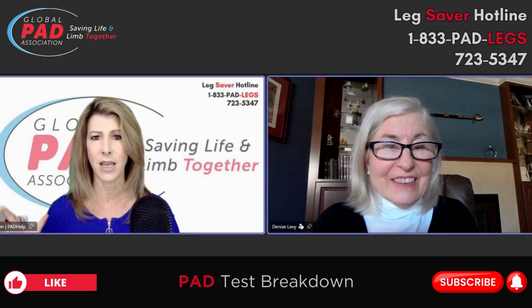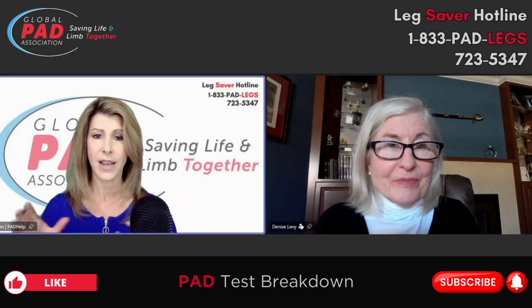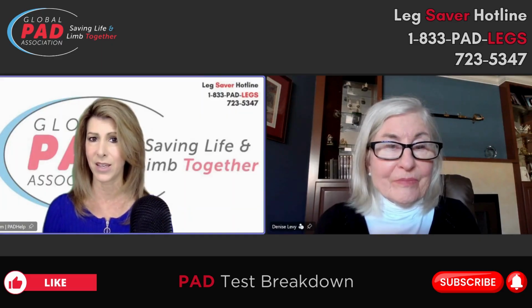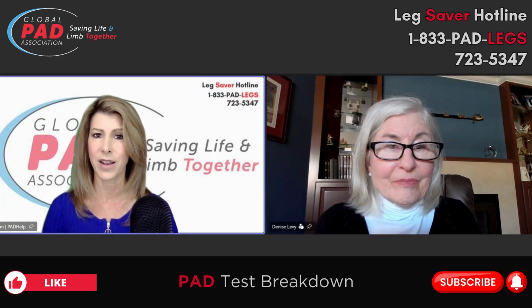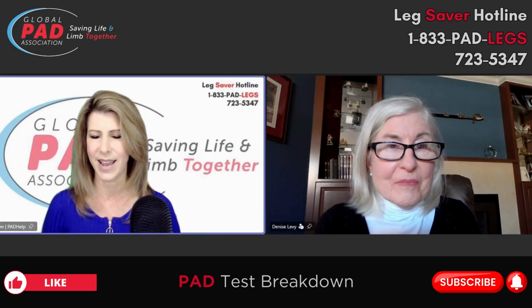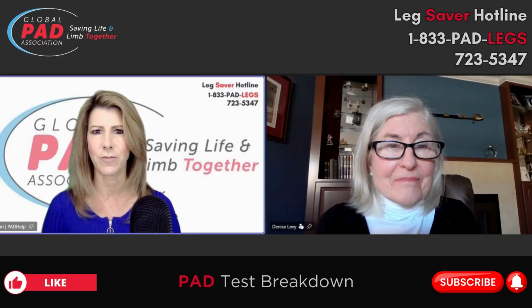We're going to take a look at an abnormal and a normal result of an ABI test. And a big thank you to Dr. Brad Hill and Minay Hill with Hill Vascular in Campbell, California, for providing these results so we can show the difference between the two.